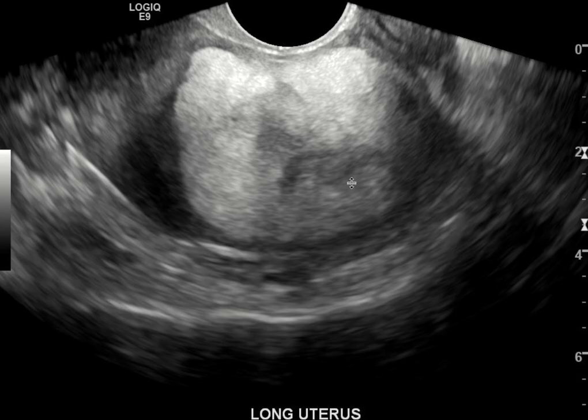The first thing would be a calcified fibroid, and that's quite common. Things arguing against that this would be a calcified fibroid is the lack of posterior acoustic shadowing. We don't see that clean posterior acoustic shadowing that we'd expect to see in a calcific fibroid.